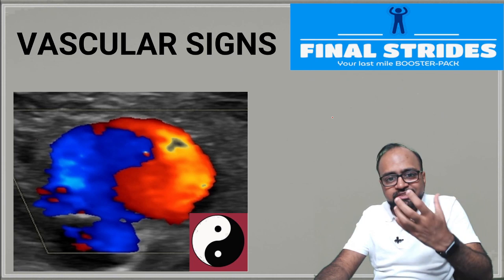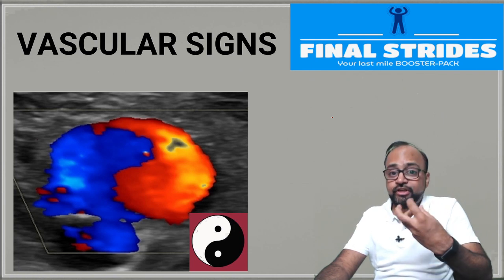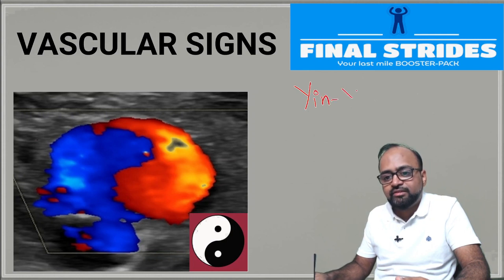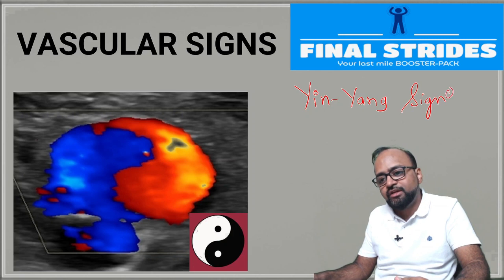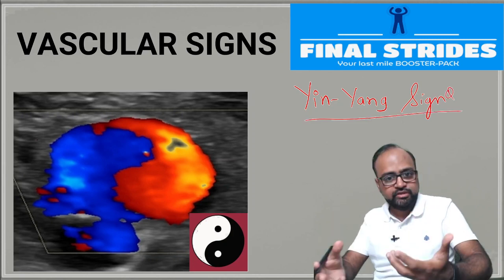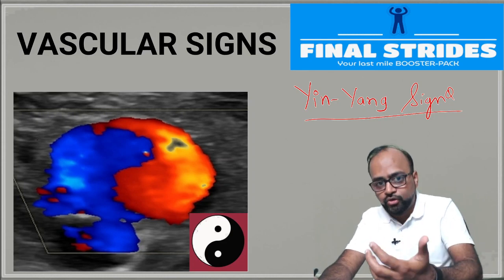Yes. Now this is a sign suggestive of turbulence. This is what is called the yin-yang sign. Yin-yang sign is based on Chinese mythology, there being a positive and negative aspect balancing each other in each particular situation. That is what the philosophical concept is.